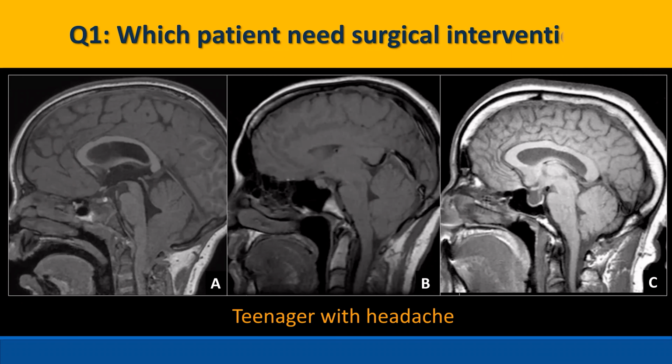Dr. Supakul, I can take this. This is Stephen. Yes, sure. Stephen, thank you. So we have what looks like a T1 sagittal. Actually, they're all T1 sagittal images.